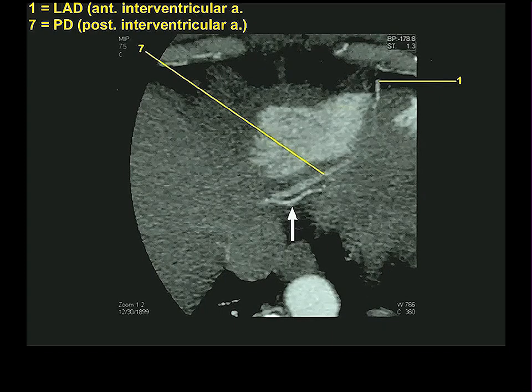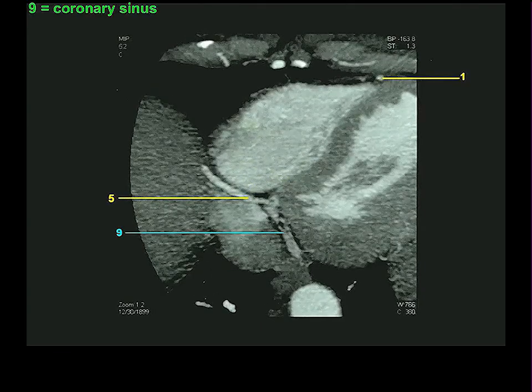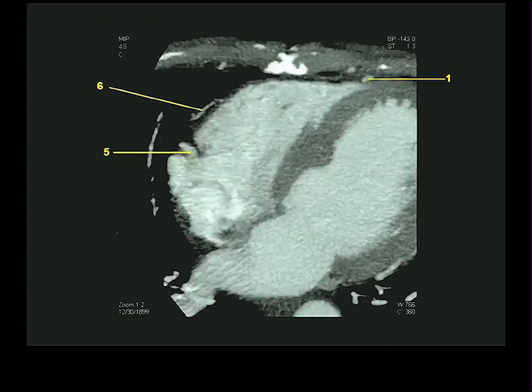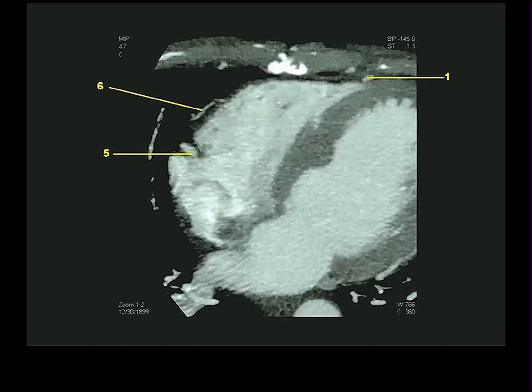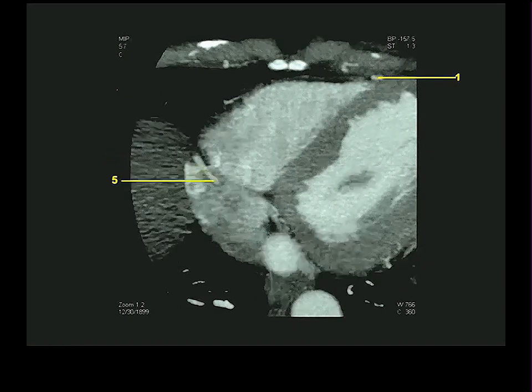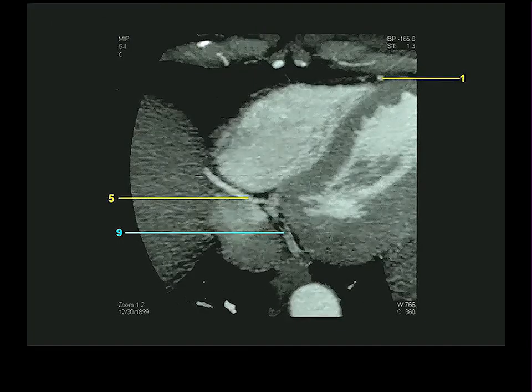This thing, I don't know what it is. What was this thing here? I thought 9 was part of the coronary sinus. Remember, I'm going way up now, here's our left atrium. Here's probably where the mitral valve is. Here's the interventricular septum. If I look at our left atrium getting smaller and smaller as we go towards its inferior boundary, it gets so small, and then we pick up this vessel there. So that's probably the coronary sinus going into the right atrium.